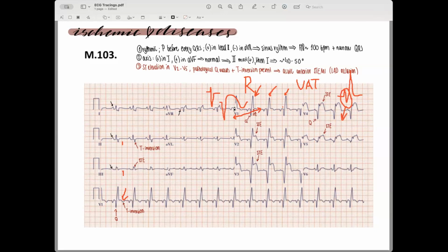But when you do see the right ventricular hypertrophy, okay, now I'm drawing, maybe I delete the old one. Okay, it means that you can have, for example, this kind of pattern in V1, and in V5, V6 you do see that it's a right ventricular hypertrophy. Okay, so it looks exactly opposite, because normally you are expecting the big R in V5, V6 and the deep S in V1.